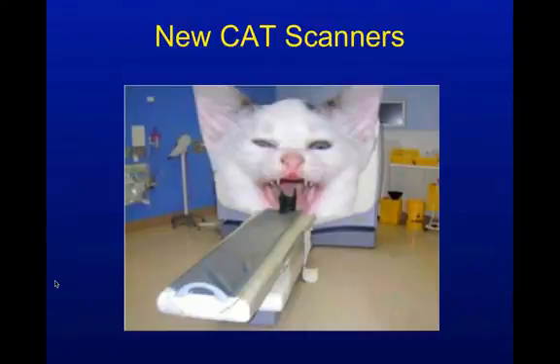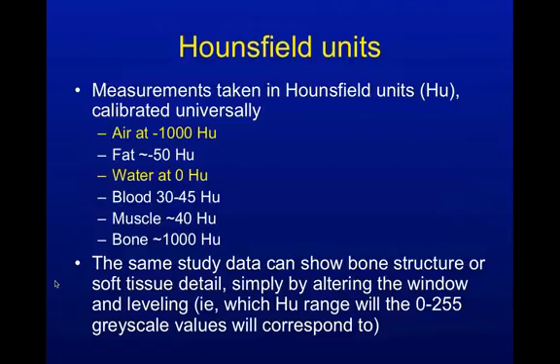We have a teaching institution, so a lot of times I get a resident read, so it may not always be accurate, and I know what I'm looking for, and they may not know what I'm looking for. Without belaboring this, you do have to know a little bit something about Hounsfield units. If you're looking at your CT scans, it's kind of done for you largely because you can do certain presets. You can do a bone window, you can do a fat window, you can do a muscle window, you can do a lung window, whatever relevant to the body part that you're looking at. And there's also a brain window as well as the bone window because you look at both.